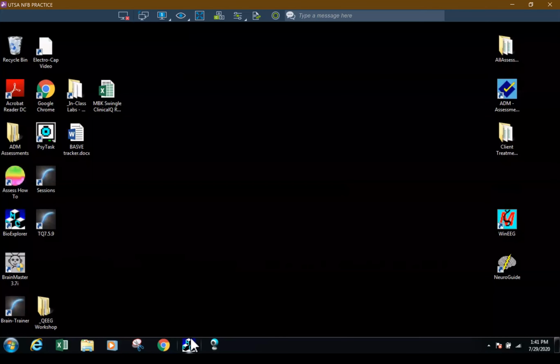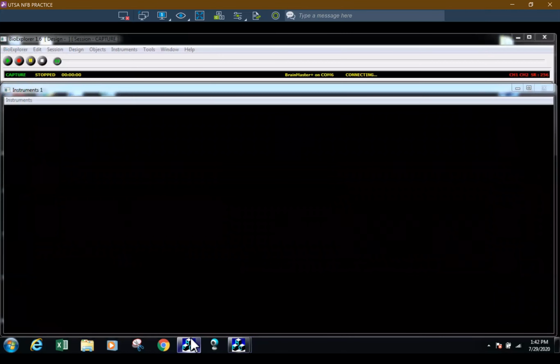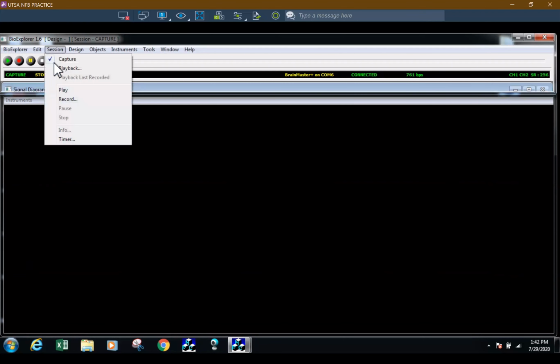So let's say we're going to do case consultation, or you just want to look at an old recording. To do that, we're going to open not the design file, but we're going to open the session file. So to open a session file, we're going to go to session. We're going to click on playback.